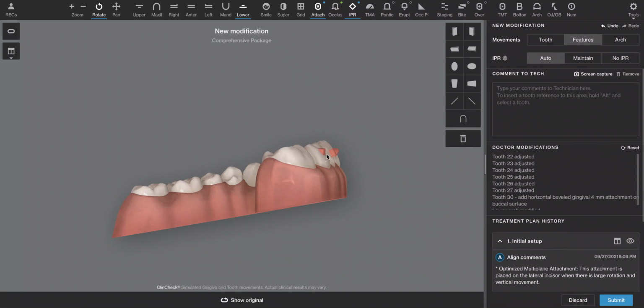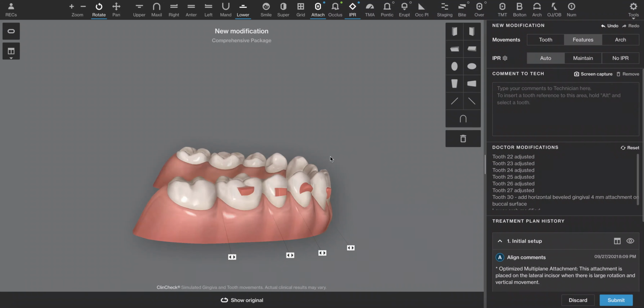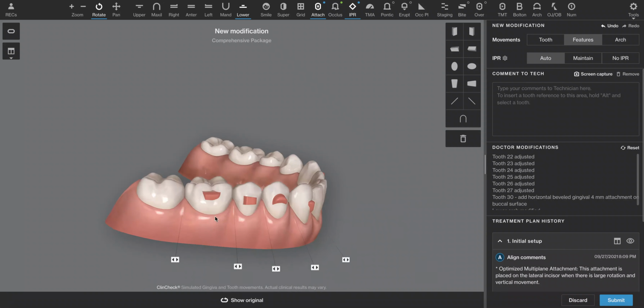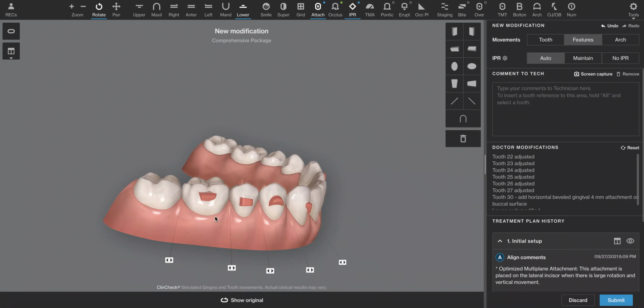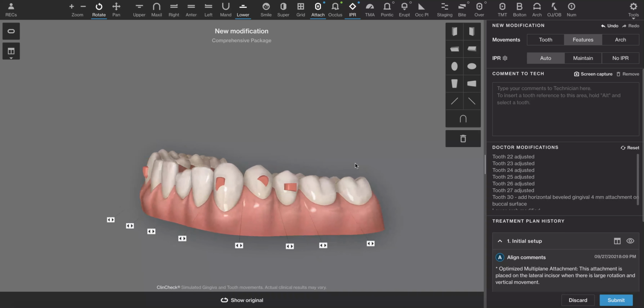What that will do, there's a supporting force of the tray that will allow the tray to stay anchored on this tooth as the tray is exerting force down in the anterior. Reciprocal retention in removable prosthodontics is an analogy. Alright, so you're going to do the same over here. I would change this button. I don't like rectangular attachments.